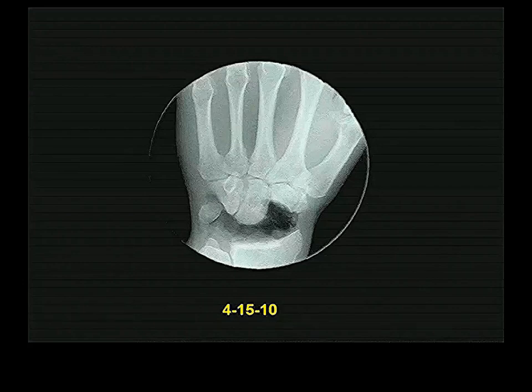So I don't know who discovered it, but apparently you can just use your capitate as an articular bone for the radius, and that gives you a more stable joint than leaving in a fragment of a scaphoid. So they just take out the whole thing. I guess that helped.